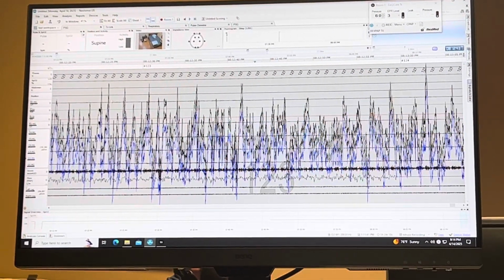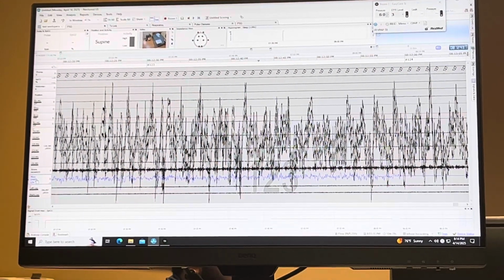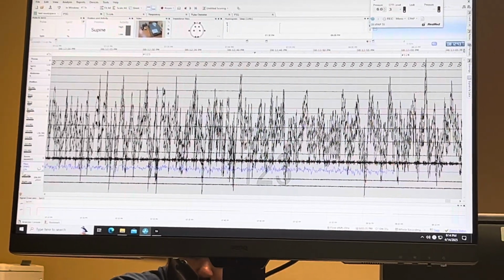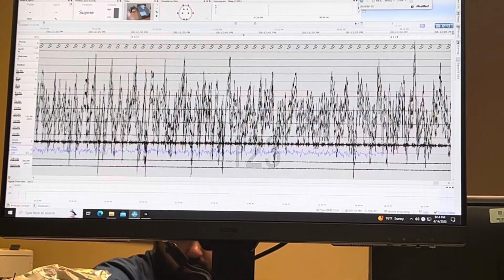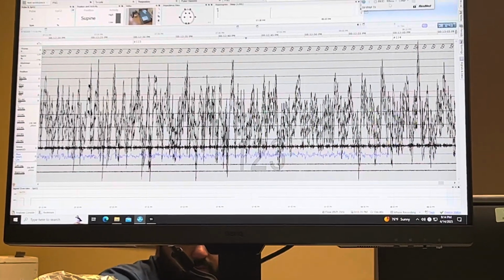So what do you usually have on your PAP studies? Do you have pressure, flow, leak, or just flow? I usually use the TX link for all of that. Yeah. But the only thing I have on my montage is the flow and the leak. The leak is at the top too, but I like for it to be on the montage as well.